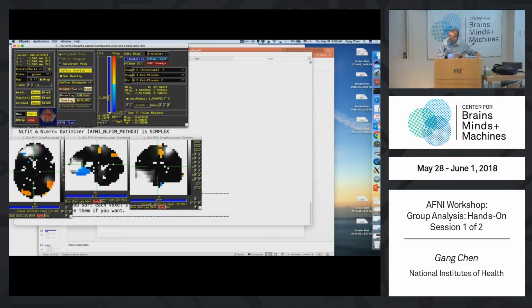You may notice, as I mentioned yesterday, under this threshold bar there's a p value, and also there's a q value. Do you remember what that q value is about? It's the FDR, false discovery rate, right? So automatically, you can use that as one way to handle multiple testing correction. In this case, there's a lot going on in the brain, so the q doesn't change much actually. So you can see here the false discovery rate is truly conservative, especially for this data set.